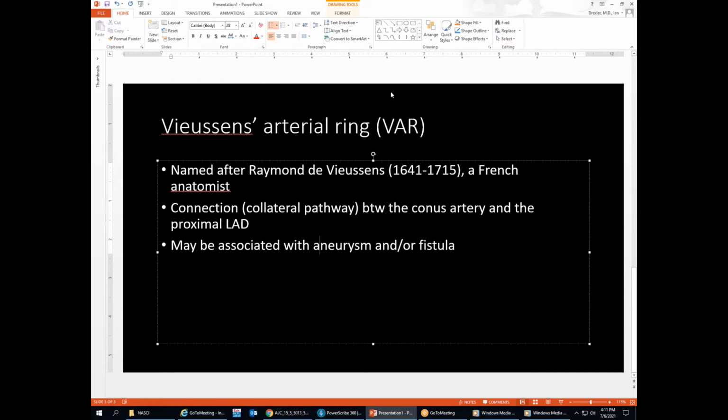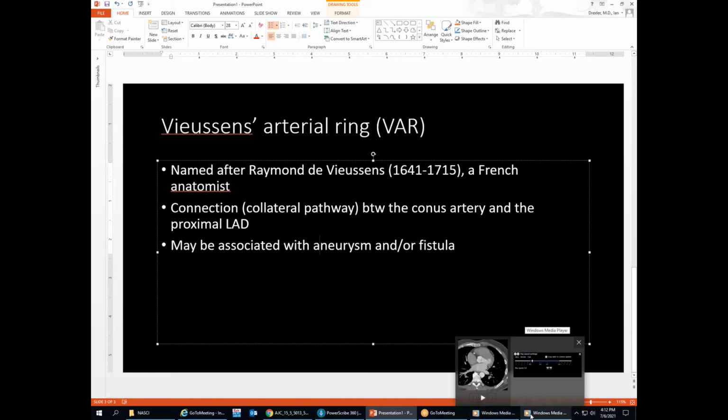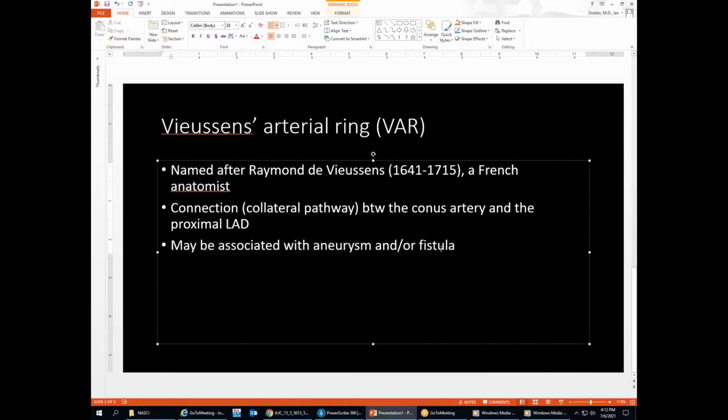And then I'll just show a couple key images. So here we have where this vessel is somewhat aneurysmally dilated. The vessel coming off the LAD is about 1 to 2 millimeters. Here it goes up to 5 to 6 millimeters. And you see this blush of contrast that comes from the vessel and goes into the pulmonary artery. And if you squint a little, you even see that in the pulmonary artery, there seem to be 2 different densities from the contrast that's getting into the pulmonary artery.